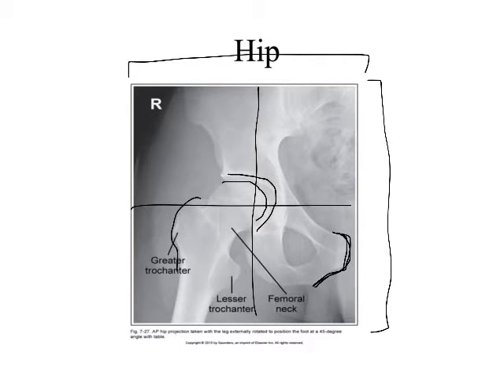Ramus. If it's plural, we would say rami. So that is the patient's right pelvic ramus. That's going to be more or less what we want to see. Now, in surgery they may ask you to include more.